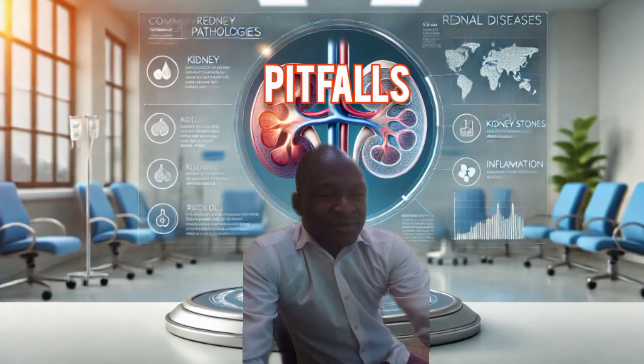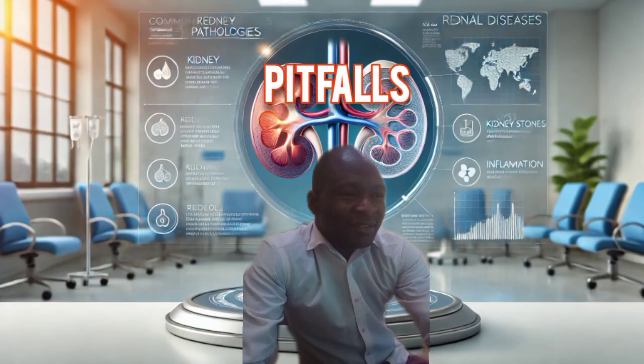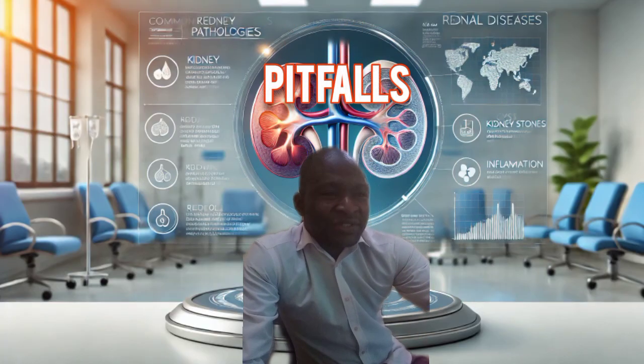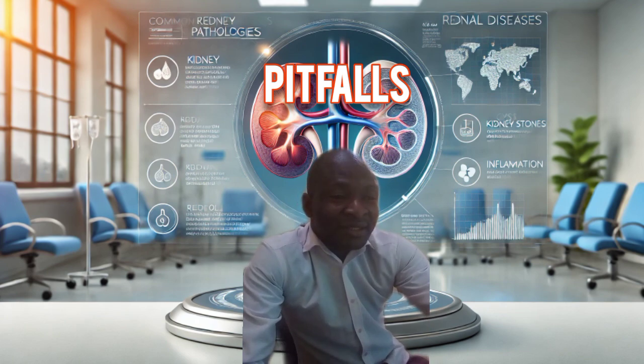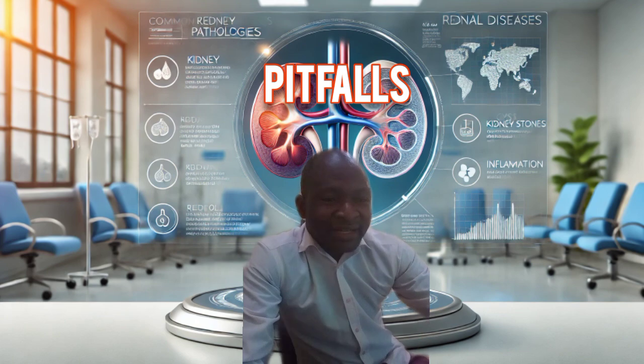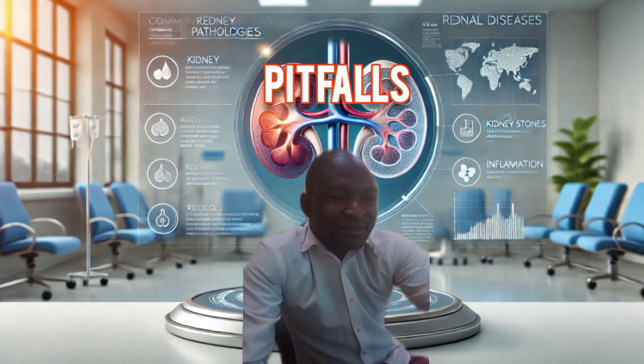The pitfall for these, the false positive diagnosis, occurs when other structures are mistaken for calculi. These structures can be arterial calcification, gas bubbles, small echogenic masses, milk of calcium in a small calyx or renal parenchymal cyst, and papillary necrosis.